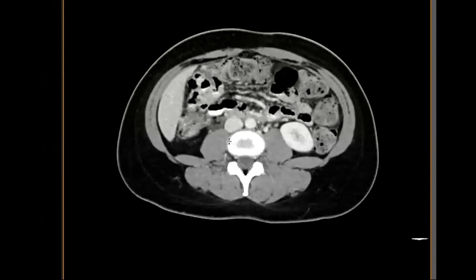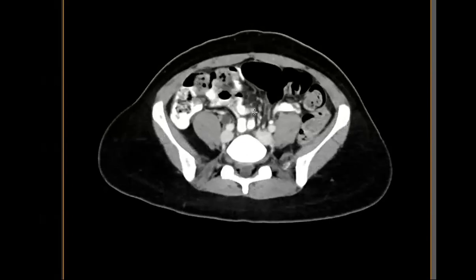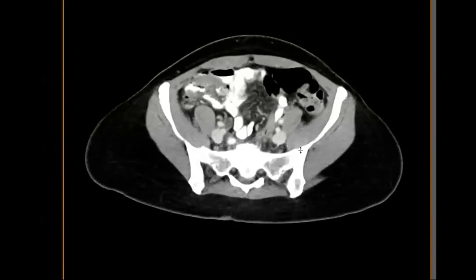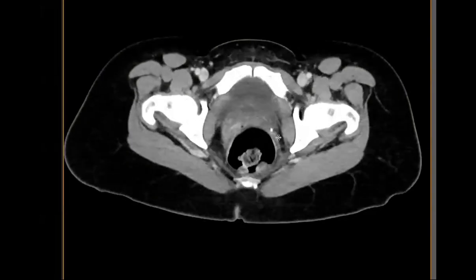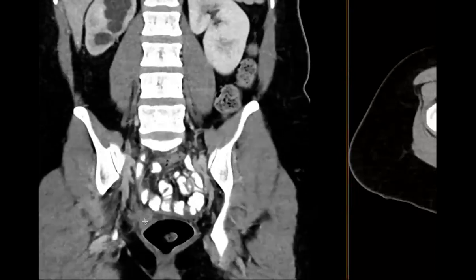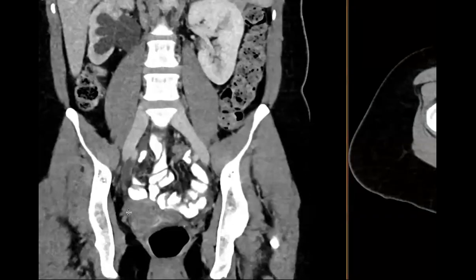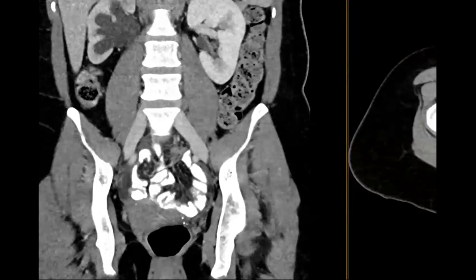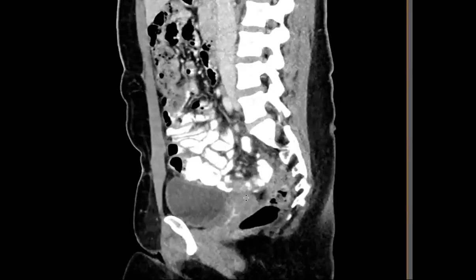Now, I happened to read the CT, and one thing that struck me was that throughout their notes, they didn't have any vaginal bleeding. They were young, and the reason they had had a hysterectomy previously was for fibroids. So without vaginal bleeding, it seemed a little unusual that they might have vaginal cancer. The other thing that struck me was that when the gynecologic oncologist examined them and felt this mass, they couldn't see anything on the mucosa, and they described the mass as hard. Here it is in the sagittal plane.